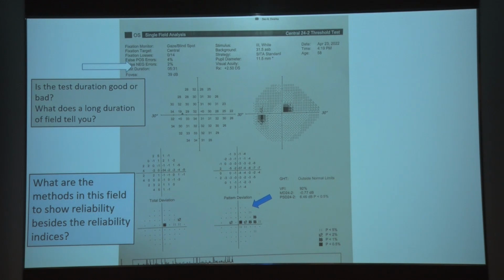Why do these spikes come? Where are they taken? They're taken on the cornea, right? On the center, so when the eye is moving, the image will be taken from the cornea only. This is actually a more sensitive indicator than those. Many times you will feel in clinical practice, all that looks normal, but the field is not normal, the patient doesn't have anything to prove. So don't look there only, look here as well, right?